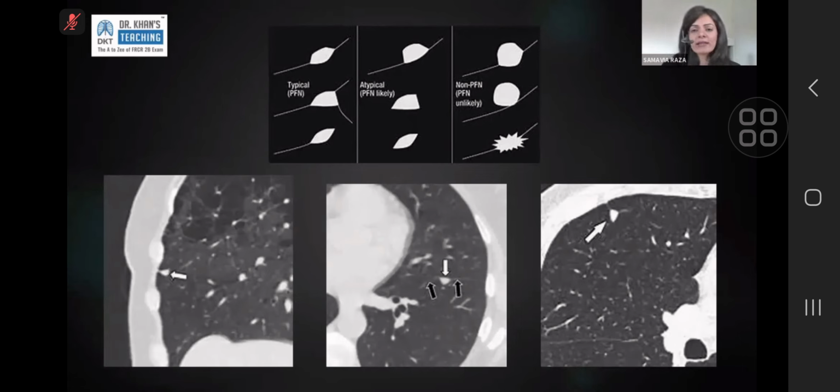When the lesion is technically in the right place that you want to call it a lymph node, you may see features that make you slightly suspicious. And one of those features that people always get alarmed by is size. The question I get is, is there a size cutoff? Can a node be too big? And the answer is no. A 1 centimeter node is still a lymph node. So you should be discounting it if it has a typical morphology and typical location.